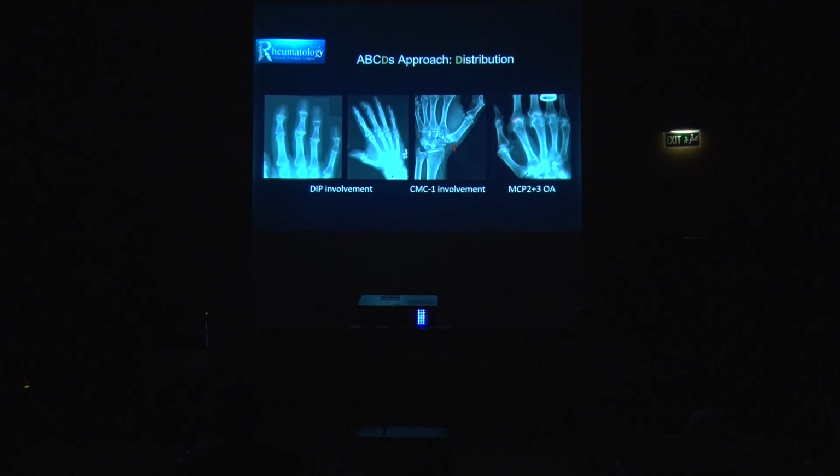You see there is joint space reduction, so that's osteoarthritis, and you see here the big osteophyte like a hook. This is osteoarthritis secondary to hemochromatosis. Hemochromatosis has a predilection for these two joints, and usually causes hook-like osteophytes. So I'm just giving you an example of how distribution of the lesion can give you a clue to some diseases.